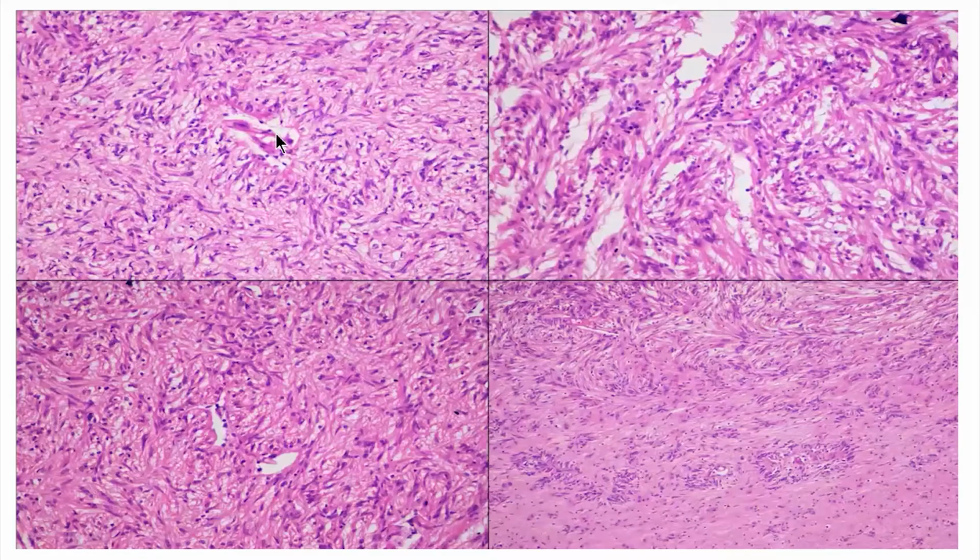But definitely, the tumor cells are arranged around these small vessels, and the cells are uniform, bland, spindle-shaped, without any pleomorphism, no mitosis, no necrosis, no endothelial proliferation. So definitely it's a low-grade tumor with a concentric schwannoma-like nodular appearance on low power, and on high power, the tumor cells are arranged around the blood vessels and they are bland spindle-shaped tumor cells.